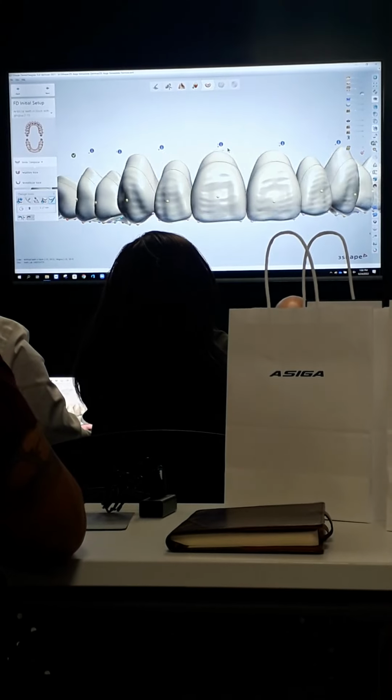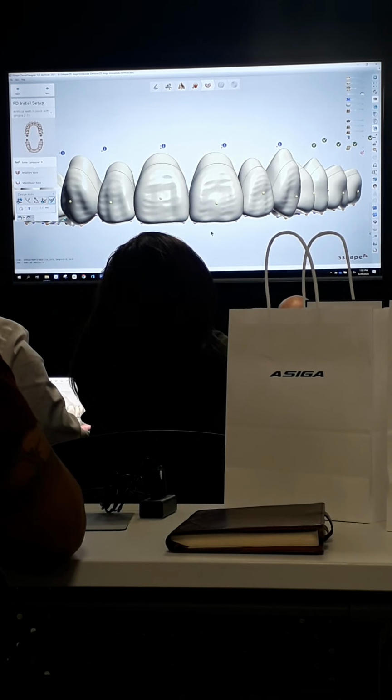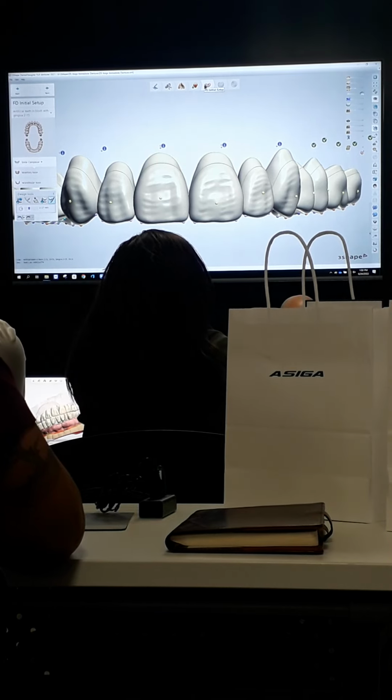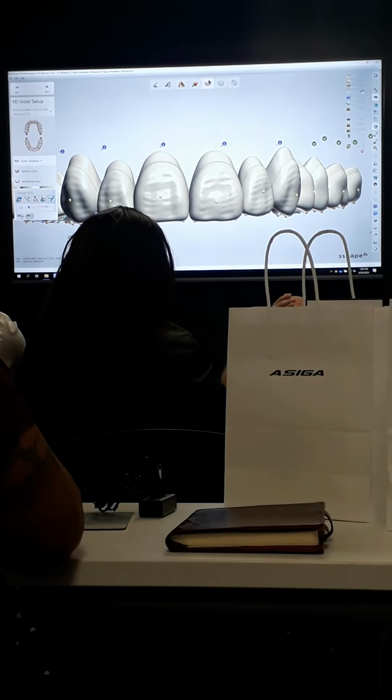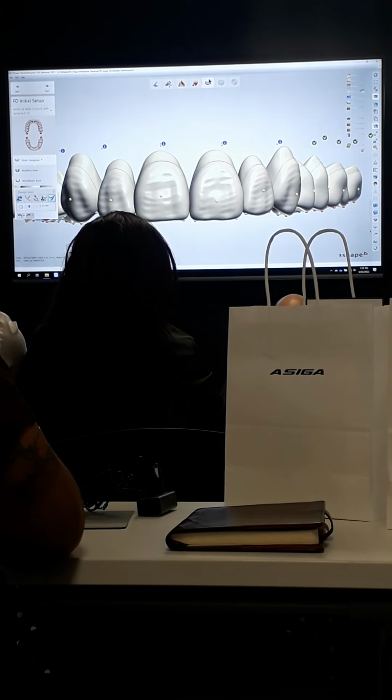So for instance, with the centrals here, I have a distal overlap and I have a mesial overlap between the teeth. If I saw one that said A, that's antagonist or opposing. So that's great for carded teeth, but if you're going to design your own teeth, this doesn't matter as much because there's going to be a bridge connector that generates in between all the teeth. So if the contacts overlap a little bit, that's not a big deal. So I don't use that for these.